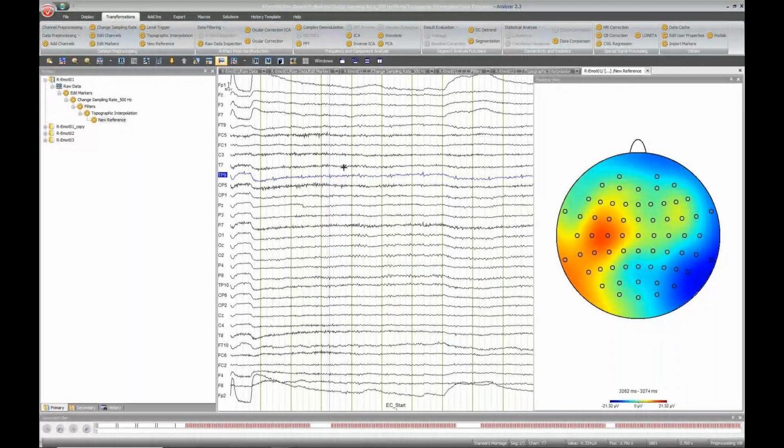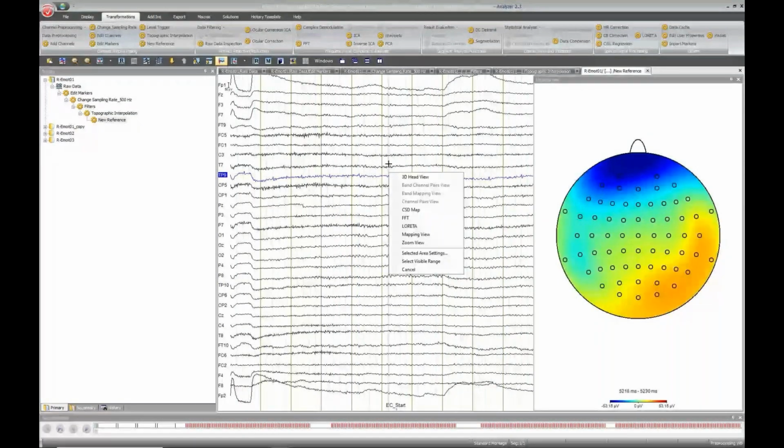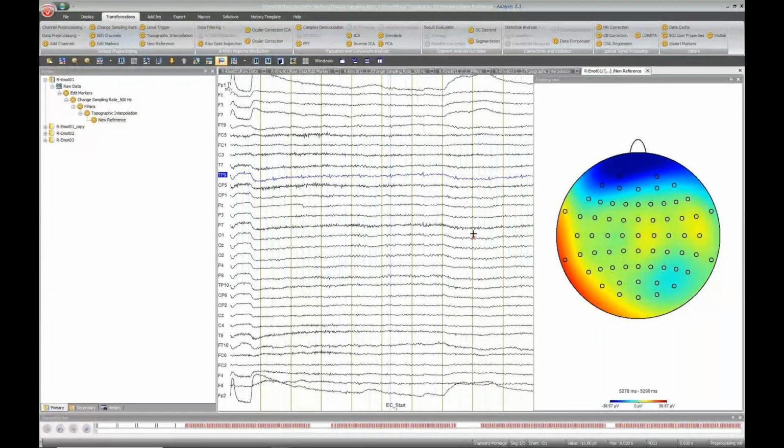And yeah, now we see more clearly that this is having large activity on this lower left area, which is typical for the heartbeat or pulse artifact. So if I come to the next one over here, it's also showing the same pattern. And if I try it again in the next one, so let me try to center. So now we see again the same pattern. So there's a possibility that having this could interfere with my following measurements.